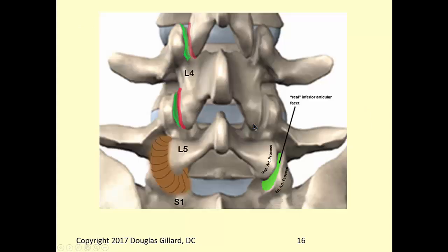Do I have another picture? No, I don't. Facet joint again. So this is the quiz, to see if you remember anything. L3 inferior articular process, all this, L4 superior articular process. Together, those facets come together to form the L3/4 left zygapophyseal joint.